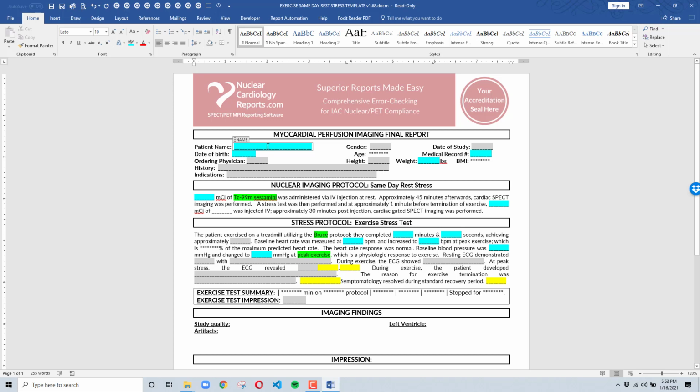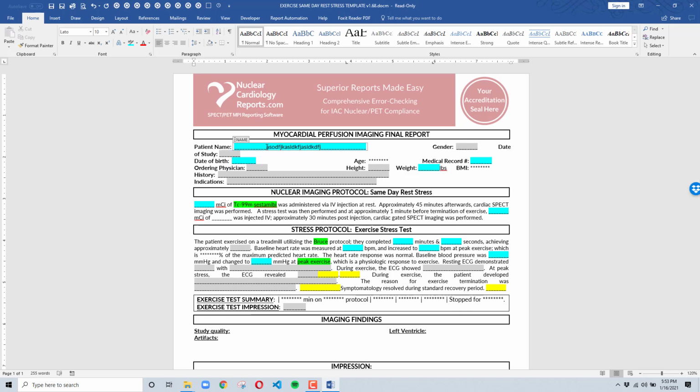Corresponding to the stress worksheet, it's pretty intuitive, but basically the first thing you do is you double-click in this blue name box, and you enter everything that you type first. If you just click in there and you start typing away, it's going to look like that. And that doesn't look right, so you need to double click. Which brings me to another important thing.